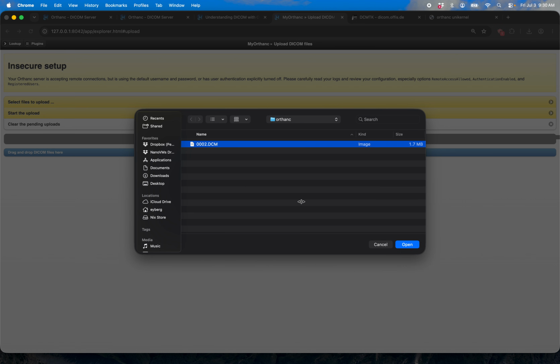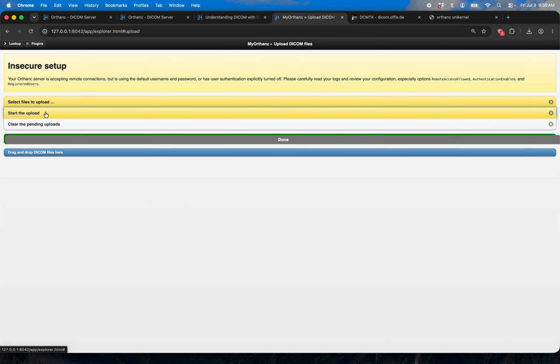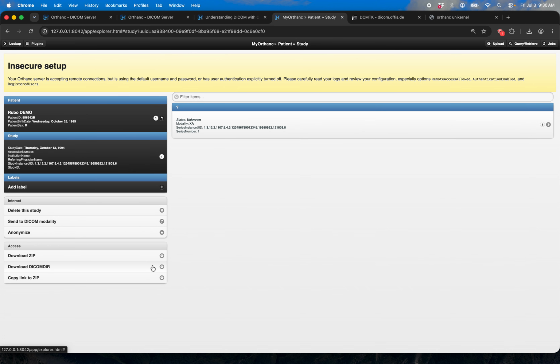Obviously, if you're actually going to work through this in a real setting, you'd probably have other things. So we go ahead and upload it. It says done. I believe it's done. Let's click back so we can go to all patients. We can go to all studies. I'm just going to click on all studies. So, Rubo demo, study date of 1994, 95.